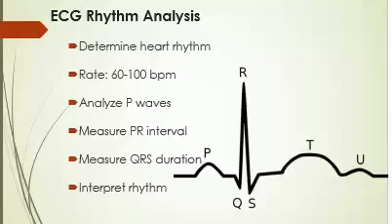The next thing you want to do is look at and evaluate your QRS complex. Do they look the same? Do they follow a P wave? Are they wide? Are they narrow? You want to really look at your QRS complex, okay? And remember, with your QRS complex, they're supposed to be less than 0.11 or 0.12. So that is also important. The next thing that is important, and I don't want to throw this out, is looking at the relationship between your P and your QRS. At this point, you can identify what your rhythm is, okay? Systematically, do it the same way every time, and it never fails. And I think that is very important for us to take.